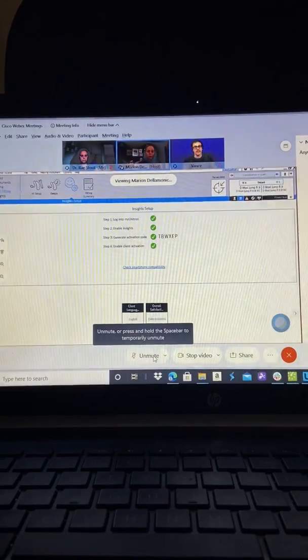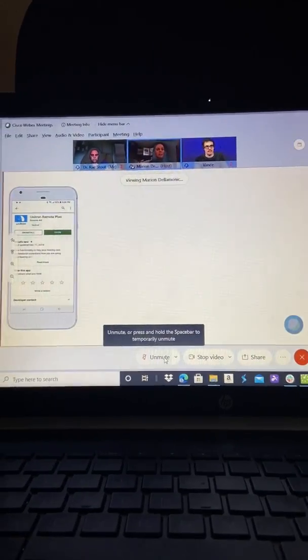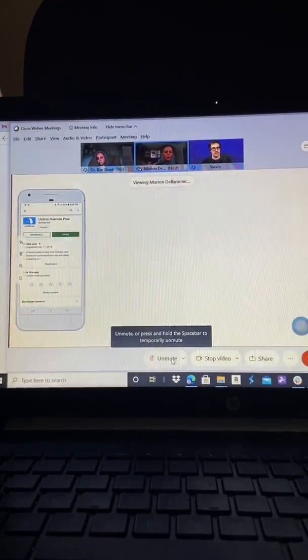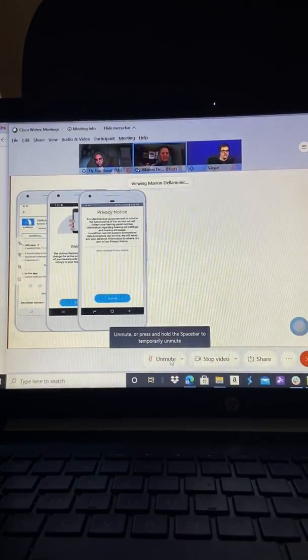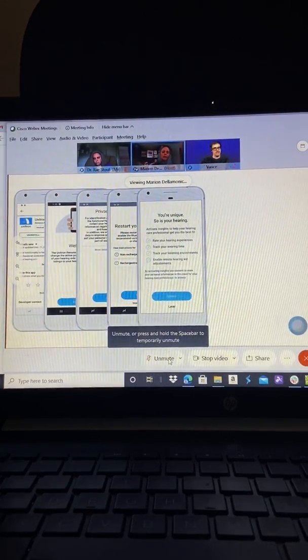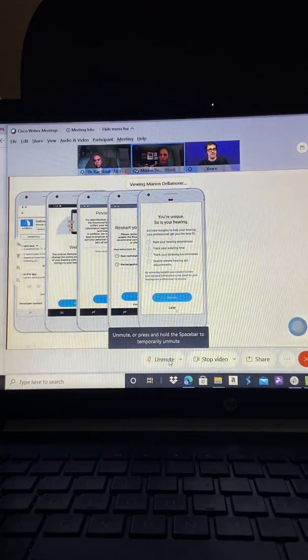Now, the second part of this is that the patient does need to enable as well, but it's not even an extra step. You've been having to do something anyway. So when you're setting up the app, you go through all of our normal setup screens. We get to this pairing screen. And right after that, when the instruments are paired, we have this activate or later option. You guys may have been clicking later.